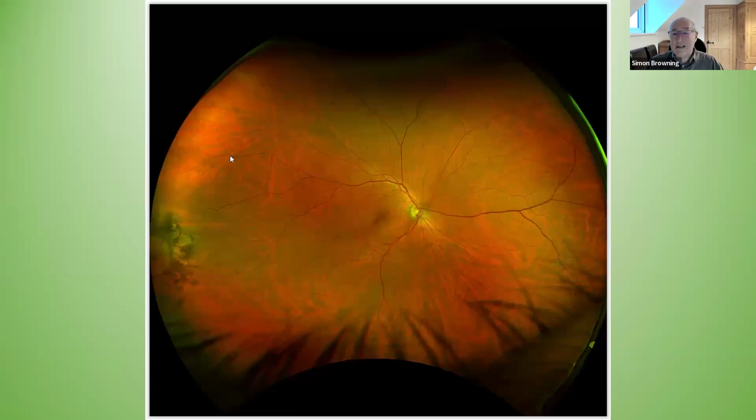And another classic sort of degeneration here, you can be fooled sometimes into thinking these look like retinal tears, but in actual fact, that is just paving stone degeneration, and here is very commonly mixed in with this, the pigment that you see there as well. So these are all forms of paving stone or cobblestone degeneration due to loss of the retinal pigment epithelium. We're going to monitor these. That's all we want to do with those.